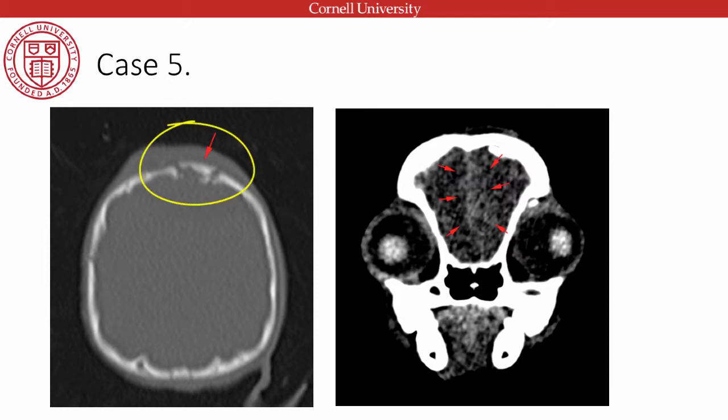So as we can see here, this is the frontal bone, this is the top of the calvarium. We're slicing her dorsally like this. We have quite a thin bone in these little Maltese dogs. They have quite round heads. And we have this small fragment that's formed in the frontal bone here. It's not depressed in at this stage, it's just fractured, rather than it being a blow that's depressed the fracture in. I'll show you some more reconstructions and you can see the extent of it.